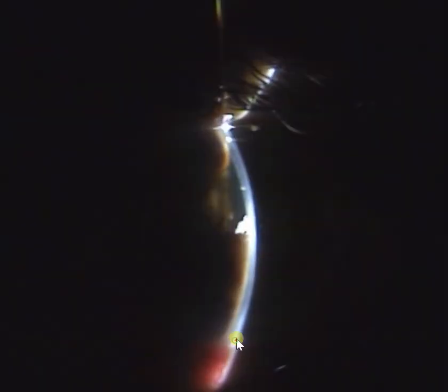And if we go forward, then we want to check what is the depth of the anterior chamber all around. If you see, this is the corneal layer which is present on the slit lamp, and this is the reflection from the surface of the iris. You can see it's very slit-like. I've just exaggerated this, probably a better line. If I draw the lines again, it is better to show it over here. And actually, this is the thickness. It's a very slit thickness over here, and this is the thing over the lens.